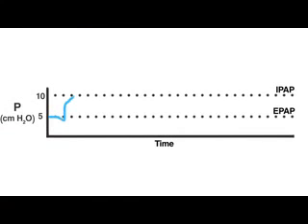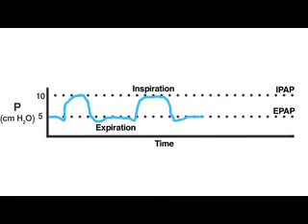This graph shows airway pressures in a patient receiving BPAP. The tidal volume correlates with the difference between the expiratory and inspiratory pressures.